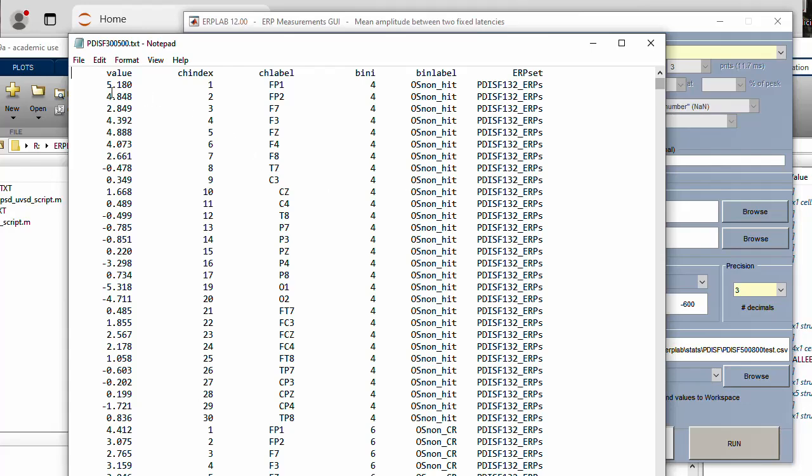So a couple things to point out here. First of all, this is a tab separated data file. This doesn't work well with a lot of editors, and reading it in for analysis can be problematic. That's why I'm going to clean it up using Python. So what we're going to do is clean this up and make it a comma separated file, or CSV file. And you'll notice a couple things. It's tab delimited, but there are also some extra spaces in here. You can particularly see it here with these electrodes. So we're going to strip those off.